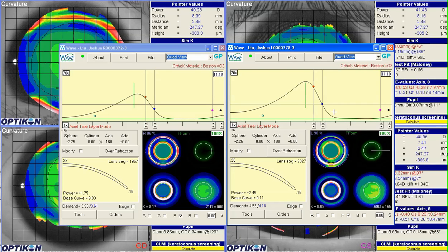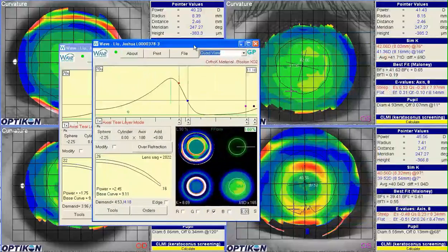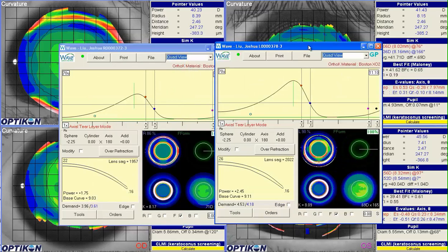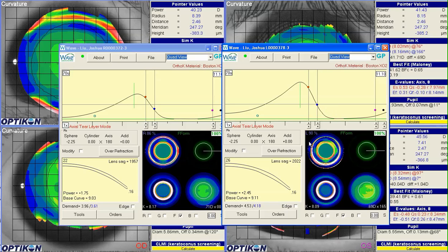I like to have most of my bearing at the very back edge of the reverse curve. And if we have too much bearing out in the periphery, that lifts the back edge of the reverse curve. So I like to pop the periphery up just a little bit. If we look at the posterior topography, it's pretty well centered, maybe just a hair low. Increasing sagittal depth is not really going to lift the lens, but sometimes lifting the edge of the lens will negate any further dropping of the lens. So I do like to get the bearing a little bit closer to the blue dot than exactly spread uniformly across the periphery of the lens.